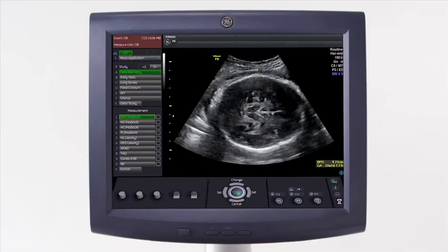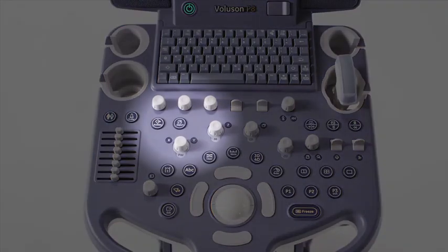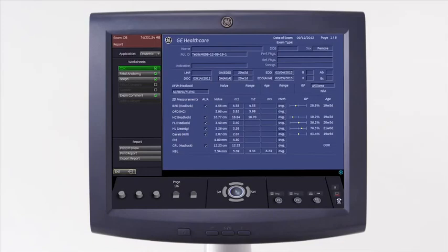Complete measurements with the trackball and set keys. When an ellipse function is needed, the ellipse cursor will become active after the second end caliper is set. The trackball will rotate the ellipse freely, using the first two endpoints as anchors. Measurements are locked when they're completely yellow. All calculations are sent to a comprehensive patient report.